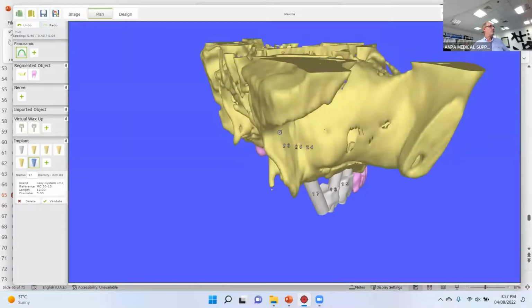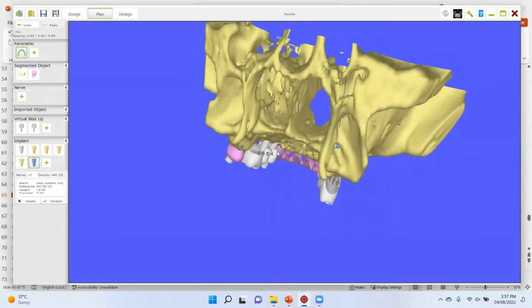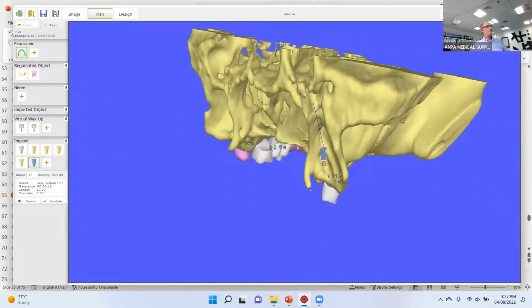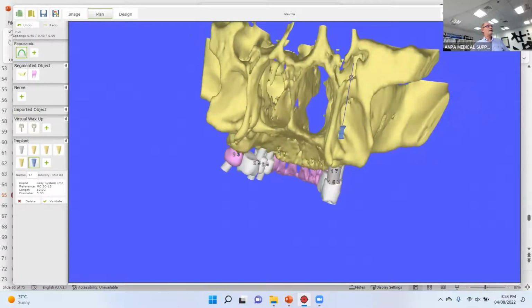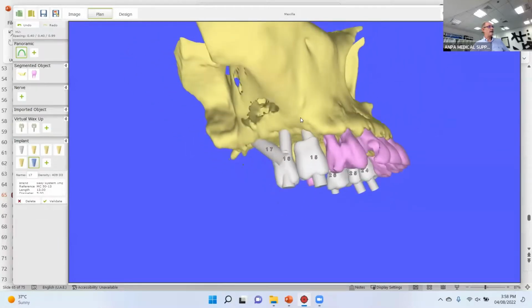If this happens, I will show you what happens then. I'm here, and voila, it's coming inside here, okay? Instead of emerging in the middle, if this happens, it's not a big deal, but I like to make it emerge here in between, because you have a big amount of bone that you can use here, okay? So this is how you can take care of that.